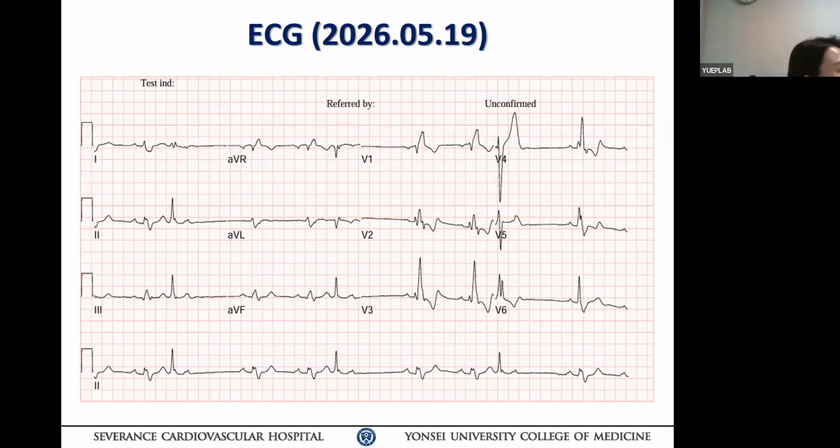Yeah, underlying RBBB. If there's a simultaneous LBBB, they make a narrow QRS, balanced conduction block. But it is not a block. It is a premature beat. So probably the right bundle area PVC makes a narrow QRS. Make sense? Conduction normalized again. And already Washim mentioned why the third P-wave is blocked because of concealment.